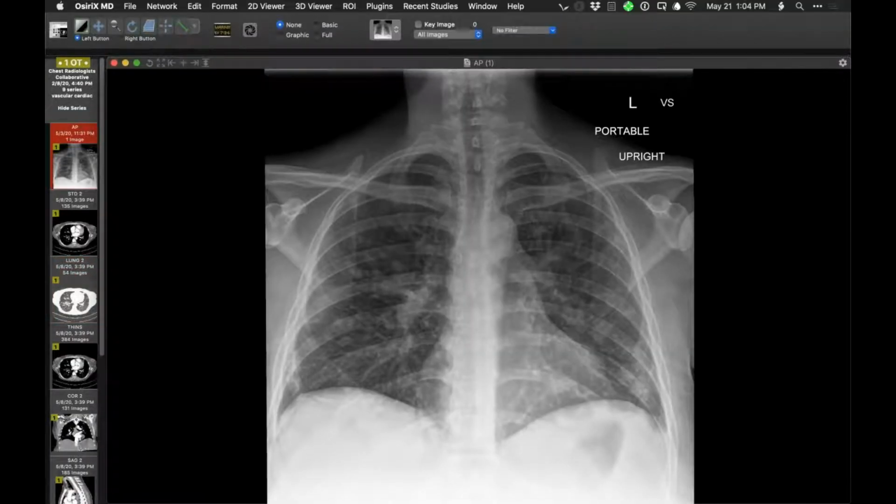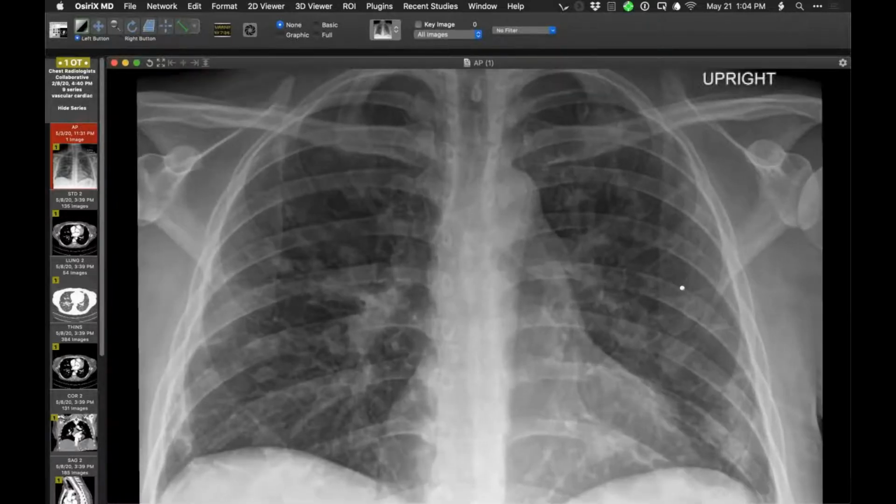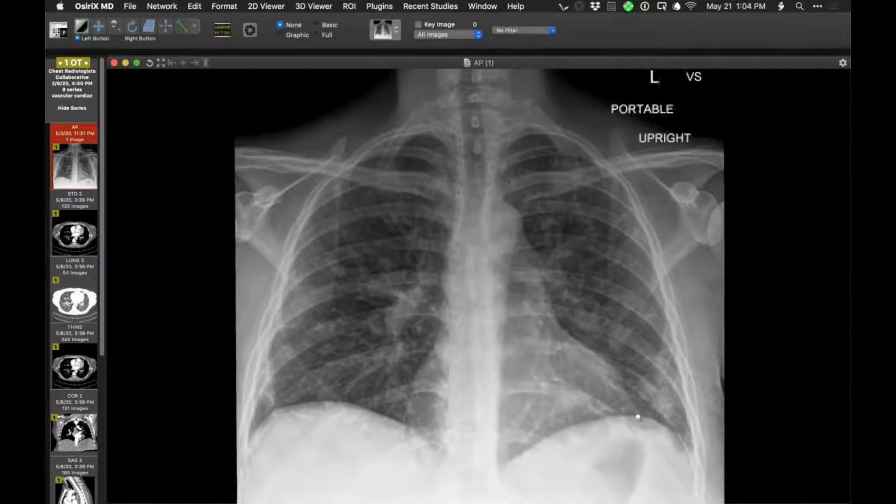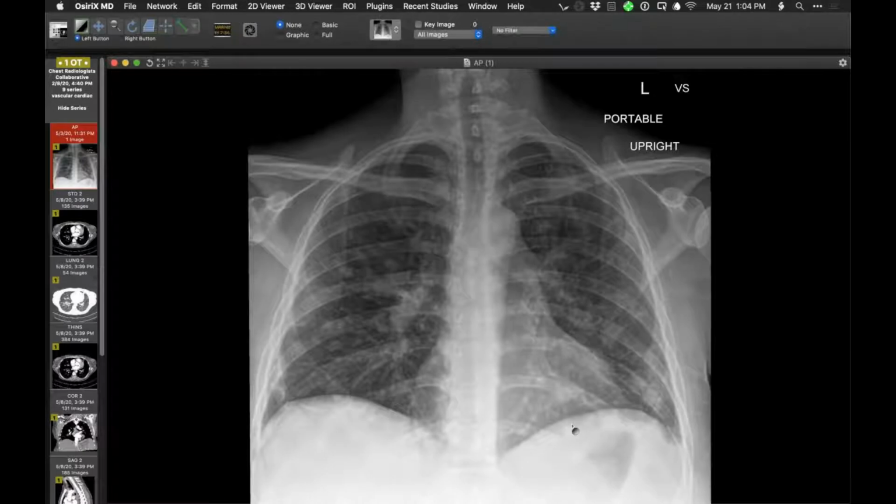The clinical context here, or the presentation really, starts in February, which I do not have, but this radiograph is pretty much representative of the pulmonary findings I did see on a February chest radiograph. So we have multifocal, multilobar nodules, and some of them are cavitated. Perhaps this one is, maybe one here. And certainly in the context of an infectious process and drug abuse, one would think of septic embolism.